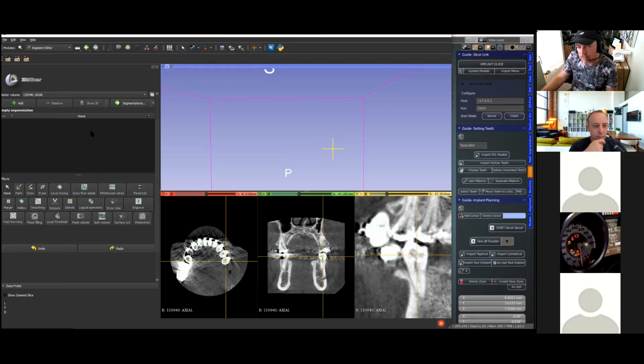So I'm going to remove this. Okay. If you wanted to save it somewhere for future reference, export it from Blender and save it. But we already have that saved because we've exported it as a segmentation model. So if you need it again, you can use it.